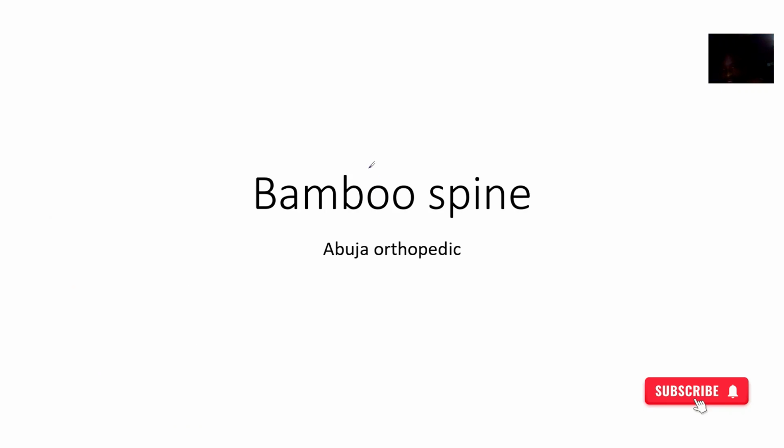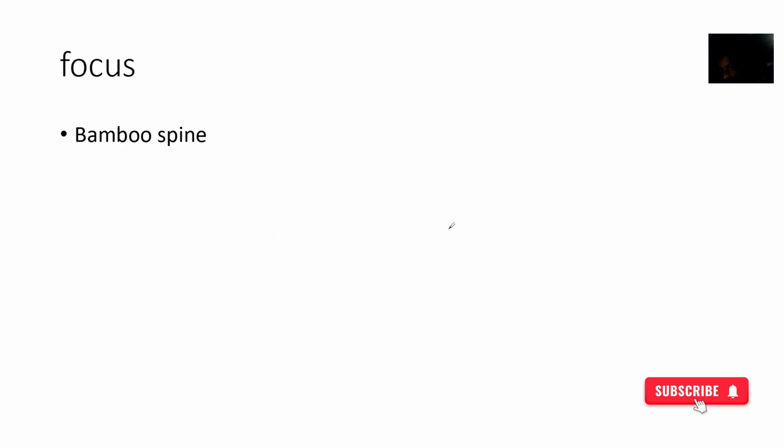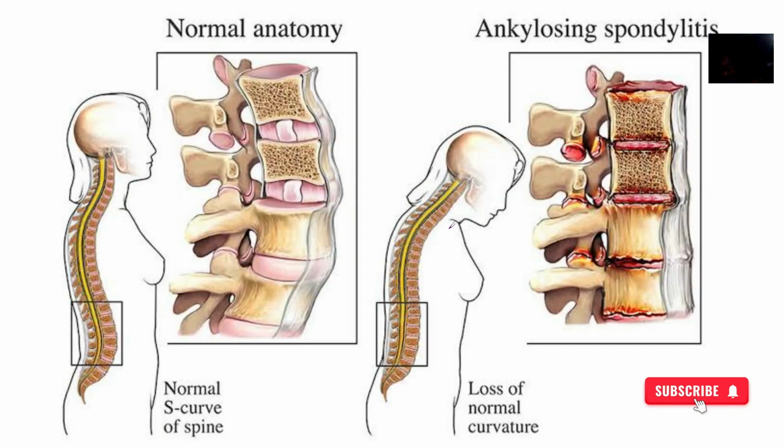Now we really try to look at what is a bamboo spine. Bamboo spine. So let me just give you the gist of what a bamboo spine is. You guys have seen a bamboo stick, right? So a bamboo stick seems to be continuous.